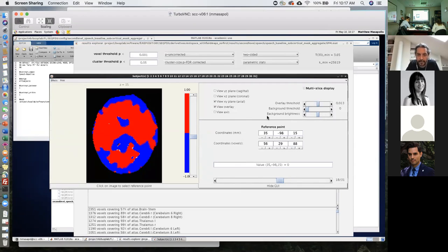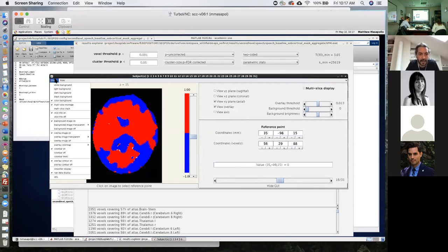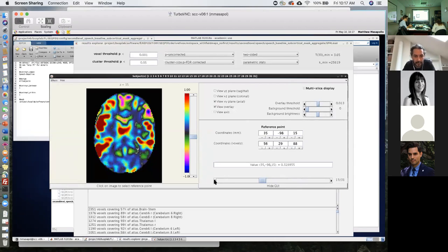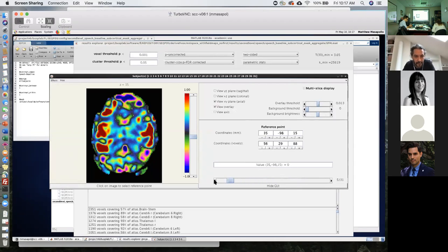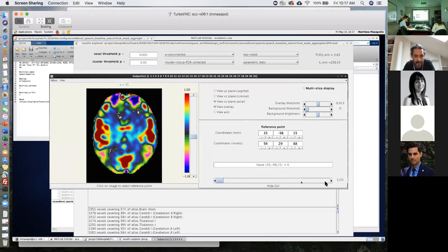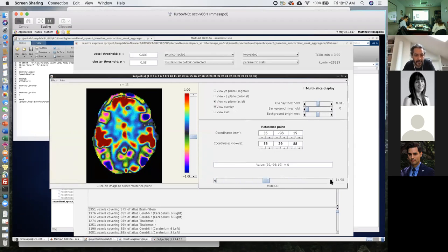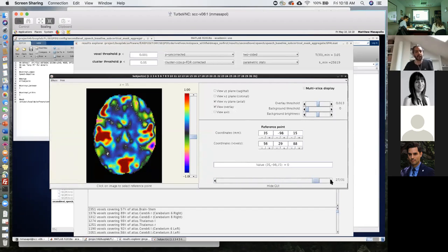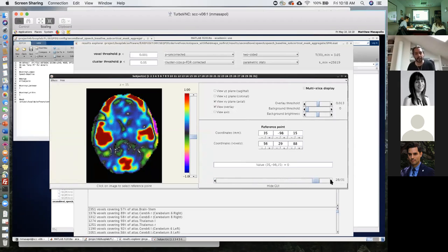Then I should use a different color for that. Let's use jet. Well, but in this case, they are not all outside of the mask. Yeah, I'm trying to see the regions that are... not in here. I cannot see it with these plots. I'll look at this later on my time and show you what I meant with the ventricles in there.